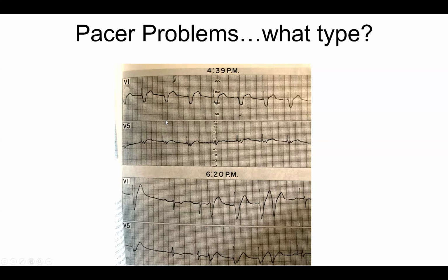So on the top tracing, how does this look? Would you agree that this looks like it's working okay? It's very bradycardic. The rate is about... What is the rate? 60 or something. Yeah, it's about 60, 65. That's pretty consistent, right? It's pretty regular. Yeah. Two leads of the same patient simultaneous, by the way.